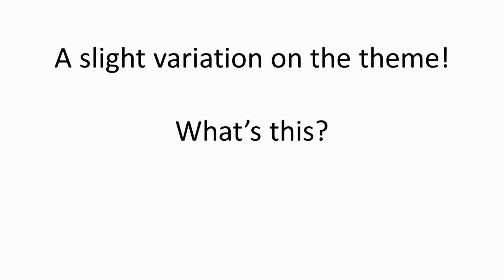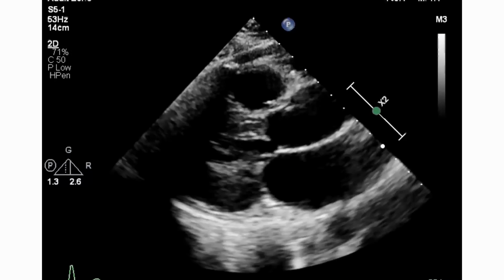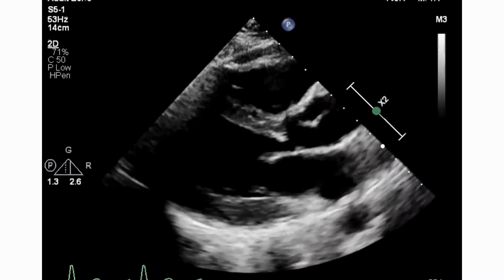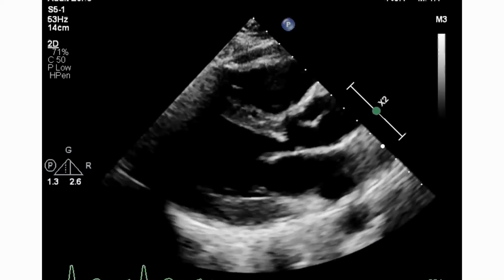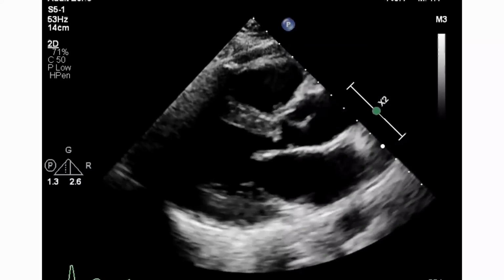Okay, so just as we finish up here, just a slight variation on the theme, and I'm sure most of you might be able to pick this up. So I'll show you the 3 slides. So that's parasternal long axis.